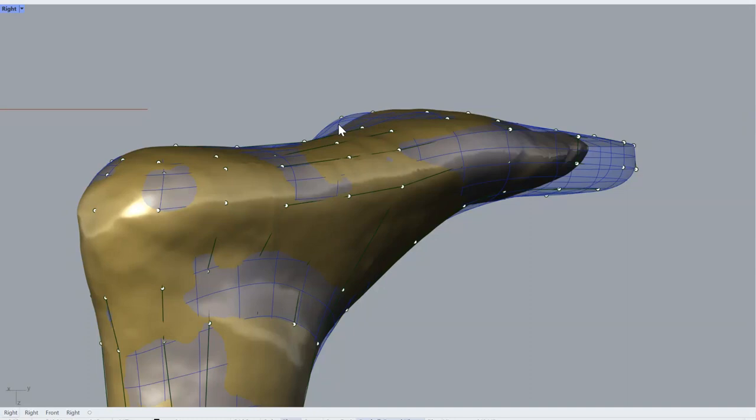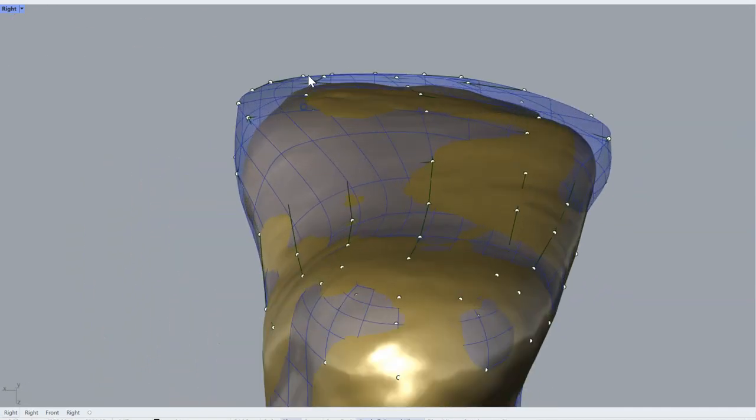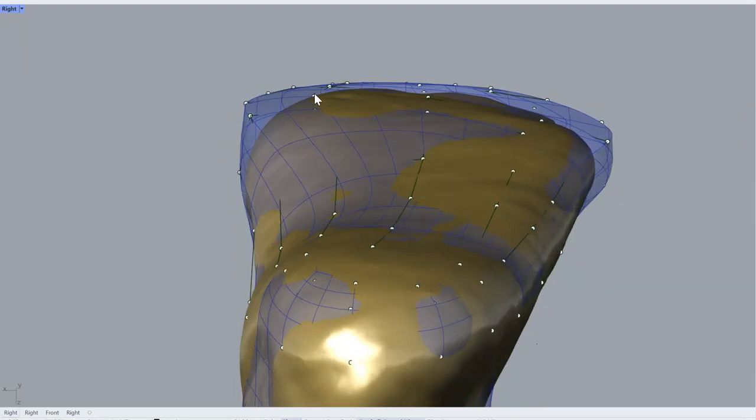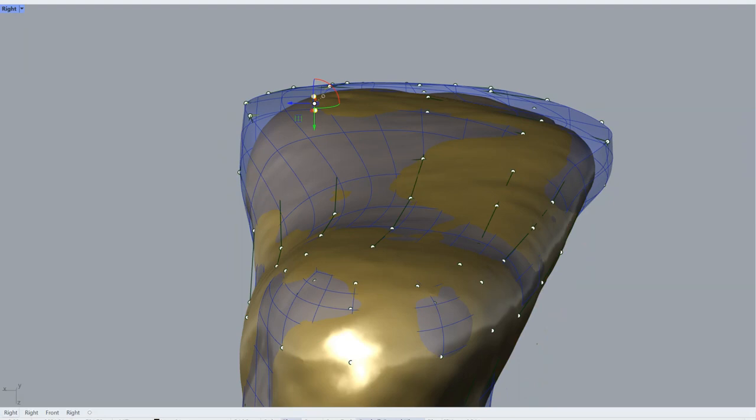Do it a lot and try to imagine how it will feel in a later shoe. You know, you have to be a shoemaker. Okay, but there are some points I'm not happy with the shape yet. I want some extra space here. Let's lock the scan again. Maybe here.